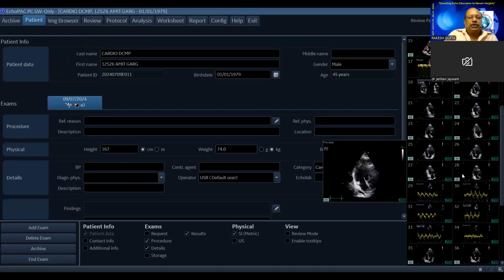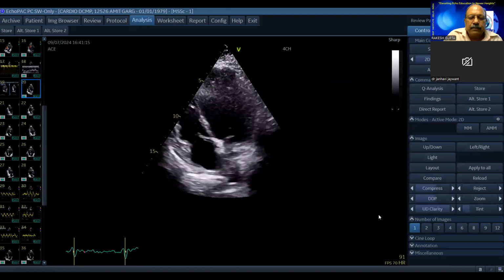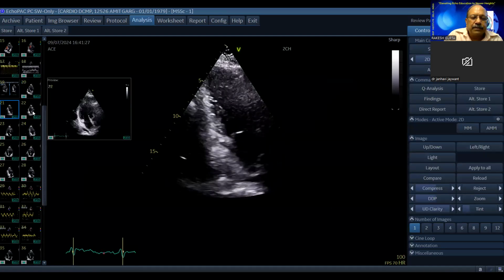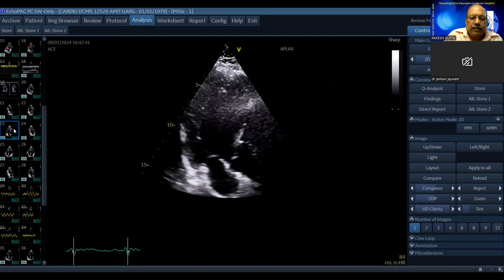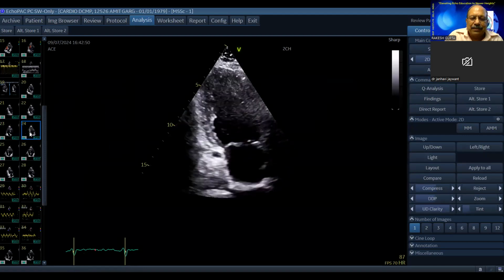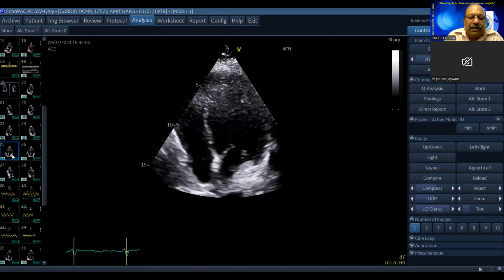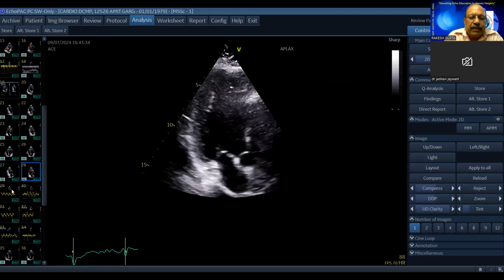Yeah. So this is a patient whom we say possibly a dilated cardiomyopathy or ischemic cardiomyopathy. Let's look at the images first. We cannot make much of a diagnosis here. This is average what we get in our lab, or you must be getting the same thing. So this guy has presented with congestive heart failure, and we went on to do a TDI for this patient.